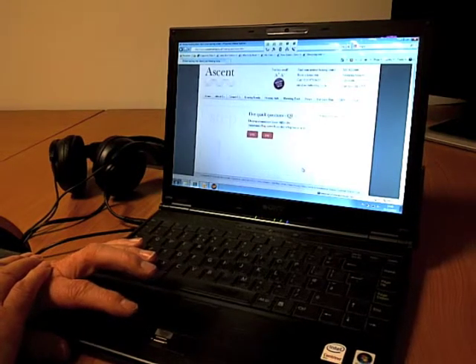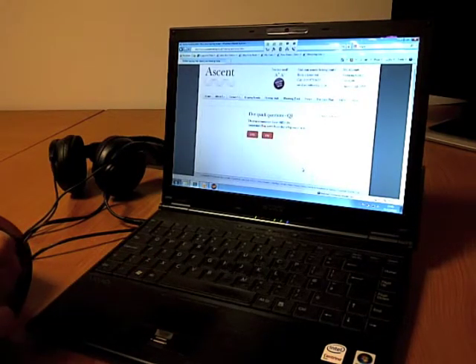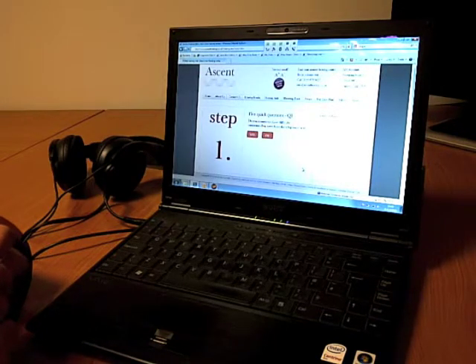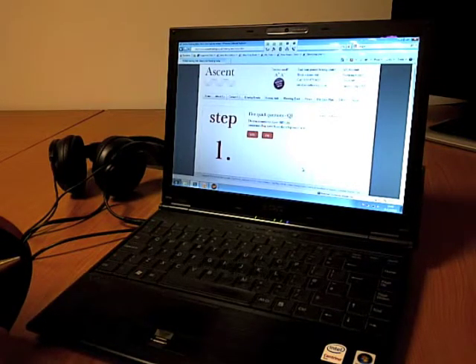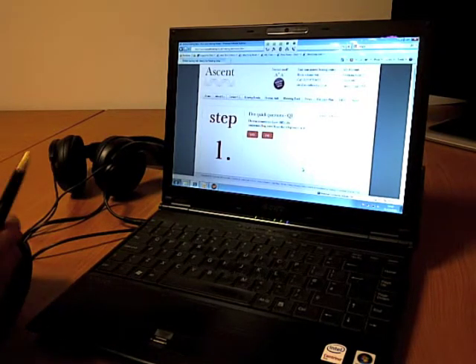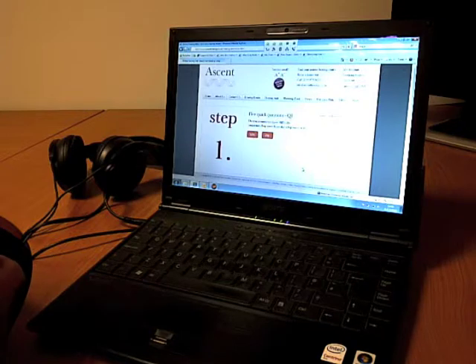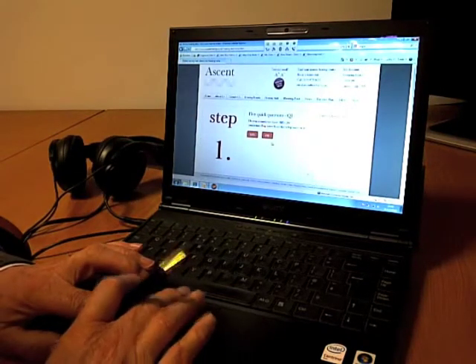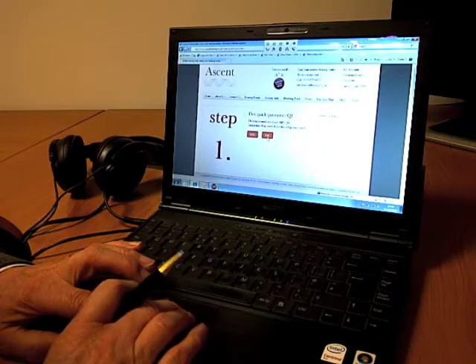The first question it's going to ask me is, do I sometimes have difficulty understanding speech on the telephone or the television? Very common sort of complaint that people have, where the edge of the hearing has just been nibbled at. And you either click yes if you have, or no if you haven't.